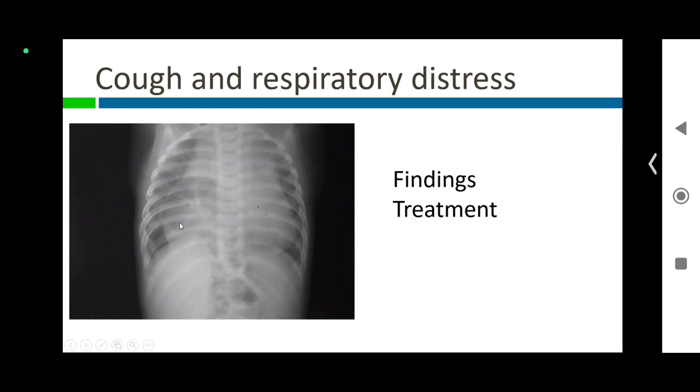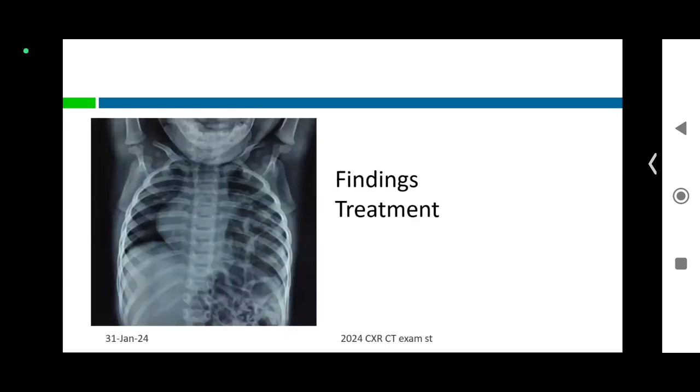It is part of the transverse colon which has gone into the thoracic cavity. Again, a diaphragmatic hernia, foramen of Morgagni. Then the other one, foramen of Bochdalek. Two types of foramen are there. So, you have hernia at different places. You will have X-ray showing different patterns.